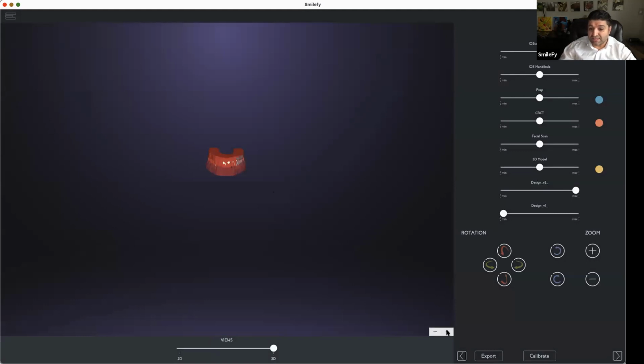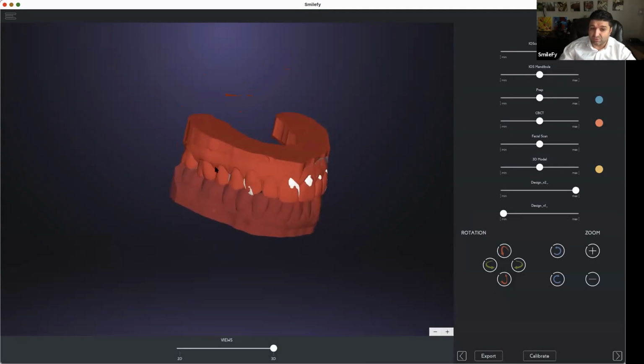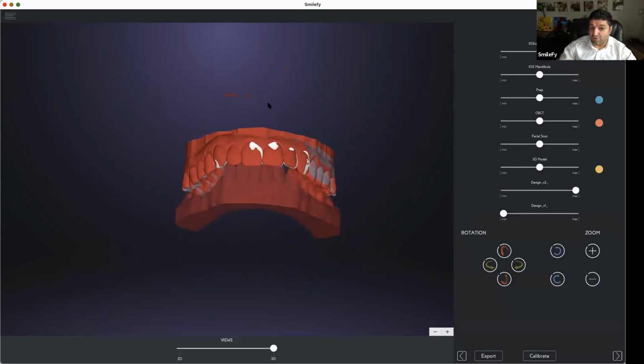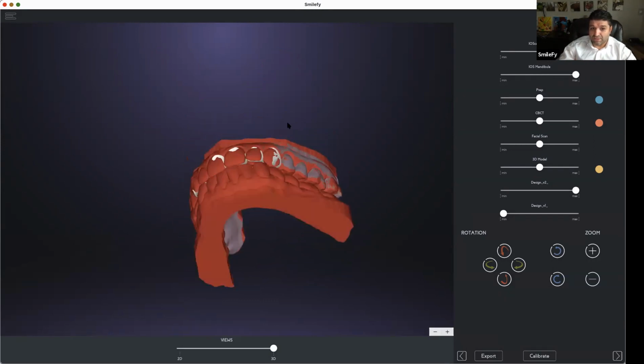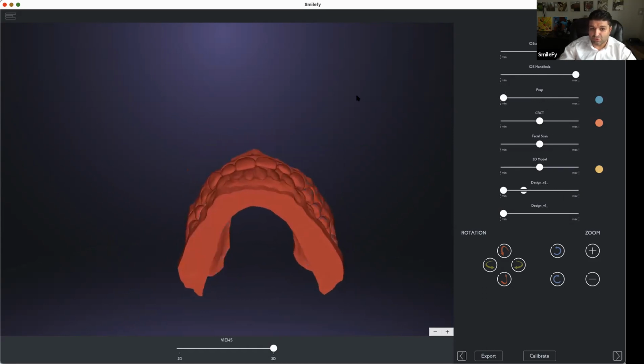If we have the facial scan, for example, then we're going to have the facial scan here. We're going to have the CBCT here, so we can bring more and more files, add the files to the digital patient, and we don't have to reopen the project and do something, because the project is going to be updated with all the new layers of 3D objects automatically. So then we can just open, and we can discuss with the patient, and of course show.